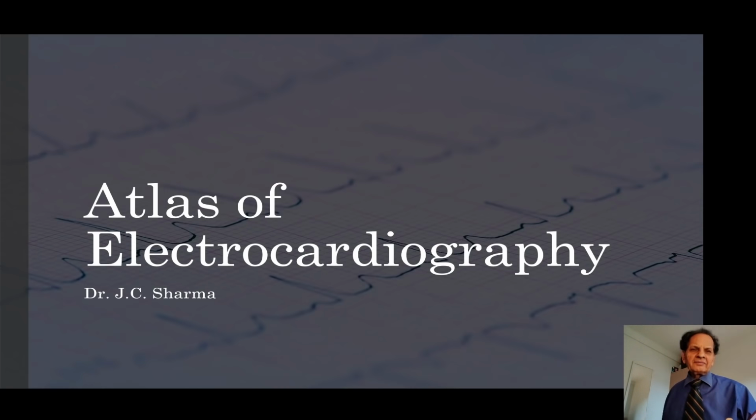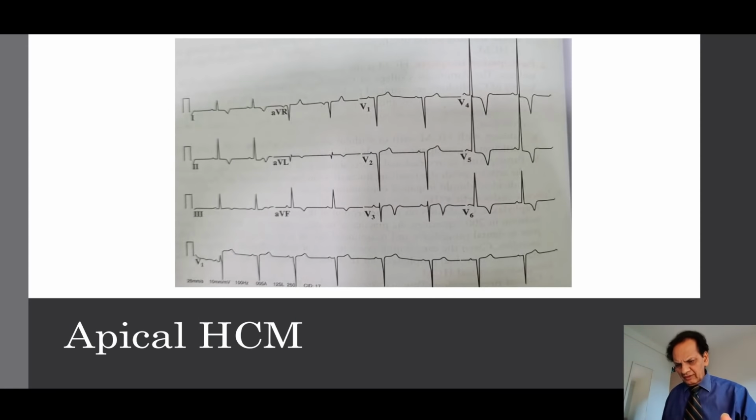Only a few hours are left, I should say. So I decided to give you a view of all important ECGs today. The ECGs which may be asked in the examination, and in your clinical practice also, and one should have a very good knack of reading ECGs because it plays a very important role in the diagnosis of cardiovascular diseases. So I will show you a few ECGs and will describe them.